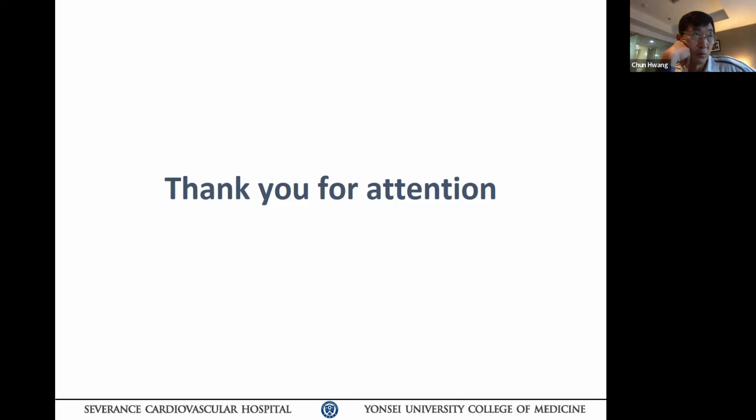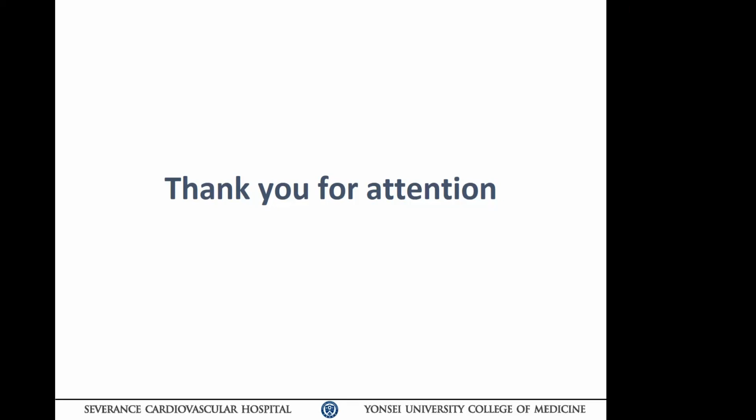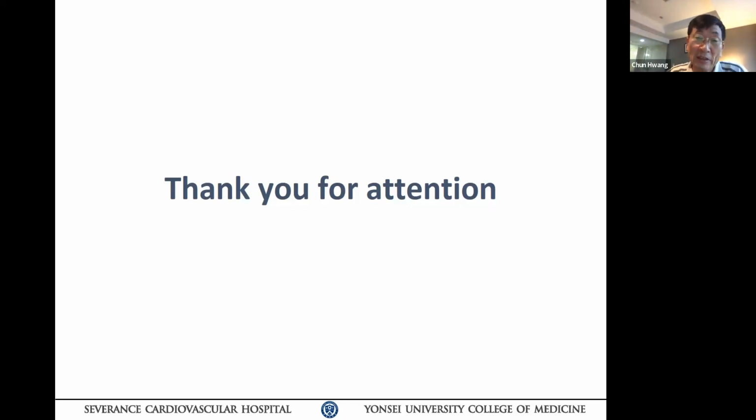So it is something you may consider if you suspect the patient has antidromic tachycardia and whether that patient has multiple pathways or not, because as you said, people with multiple pathways tend to have more antidromic tachycardia at rest. So that would be a good maneuver. You can do that in the EP lab. Okay, I will read that. Thank you for your comment.